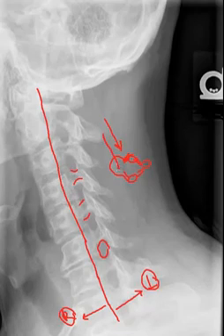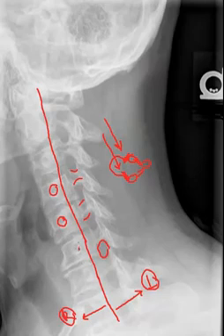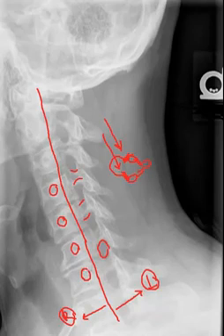The other pedicle, however, we will be looking down the length of, and in this case, we're looking down the length of the right pedicles, which is why the right pedicles look circular and the left pedicles look linear. And so once we understand the position of the patient and how it allows us to visualize different structures in different orientations, notice that these pedicles are in fact to the right of the line we drew.